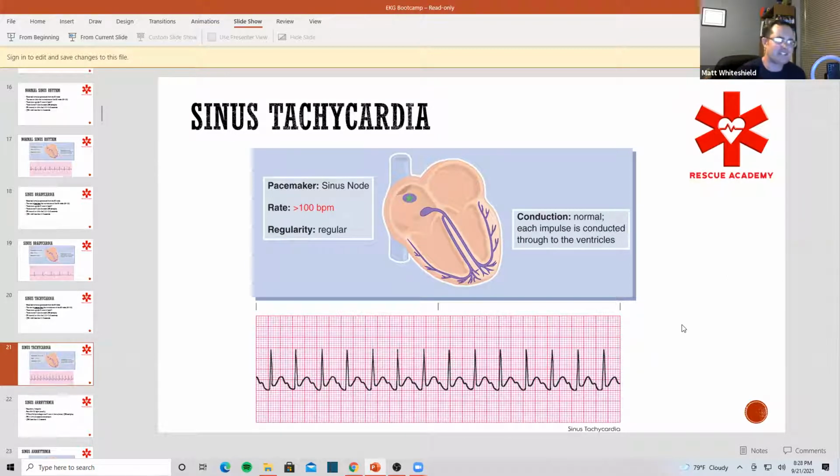Now, whenever I look for a sinus tachycardia, I know it's sinus tach and not SVT because I could differentiate T waves from P waves. Let me repeat that. I can see that there are T waves and I can see that there are P waves, and I could differentiate the two. I'm not just looking and saying, hey man, this one big blob here, that's probably a P wave, but I'm not quite sure. Here I could still tell there's two notches, and obviously the notch closest to that QRS on the left-hand side is the P, then the other one's gonna be the T, but they're getting too close.